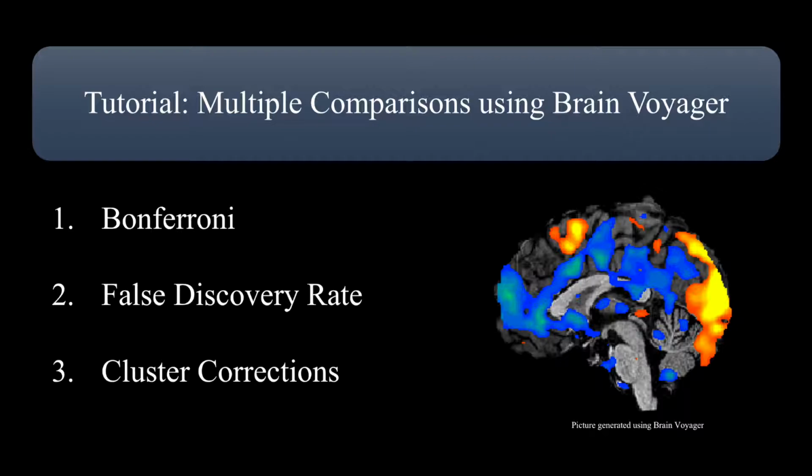The actual pace of this video does not reflect the time that it will take to fully grasp the information in the tutorial. Please speed up, slow down, skip, and pause the video where you feel appropriate. The information from this tutorial can be applied to any neuroimaging data requiring corrections, but for the specific purpose of this tutorial, we will be analyzing a dataset of 12 participants where the activation in the face-specific areas of the brain was measured in response to photos of faces and hands where the direction of gaze and pointing was experimentally manipulated.